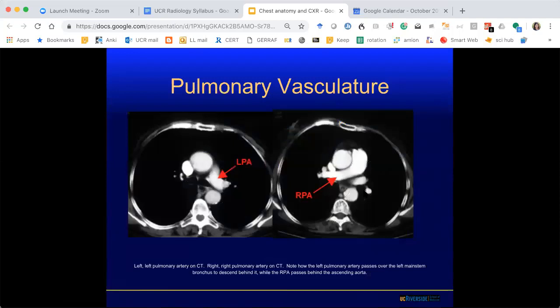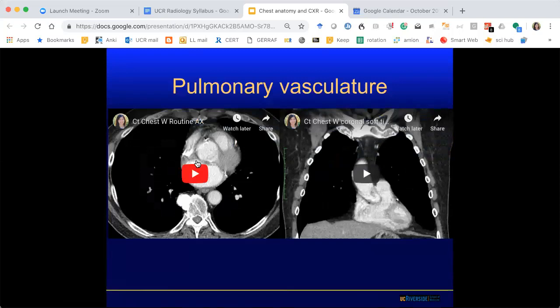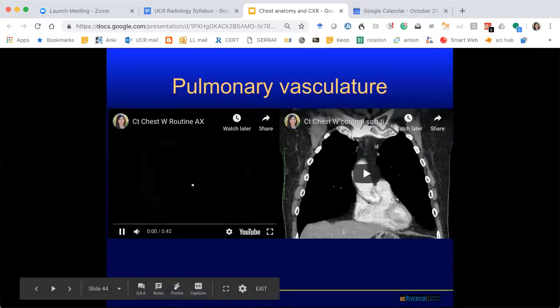And that's actually more predictive of pulmonary hypertension than the size cutoff, because some people can just have small vessels, especially when they're small or young. So the ratio helps to clarify that. Okay, what vessel is this? Aorta. Good.